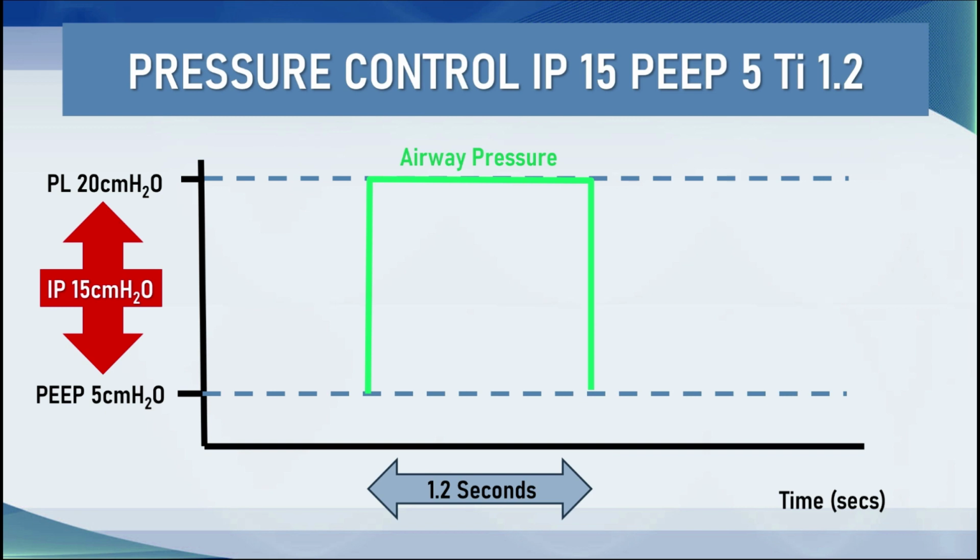One or two things to mention now. First, that the airway pressure and the alveolar pressure are not identical. This is what the alveolar pressure looks like.